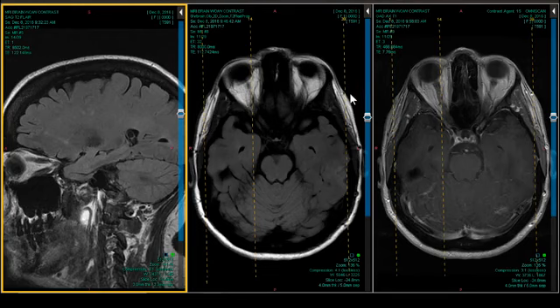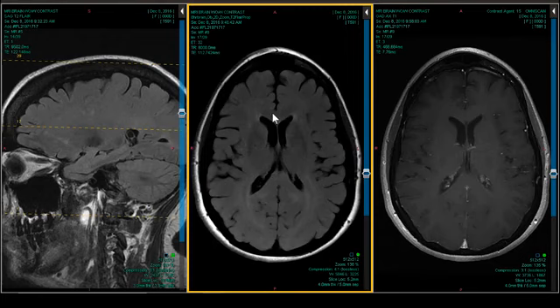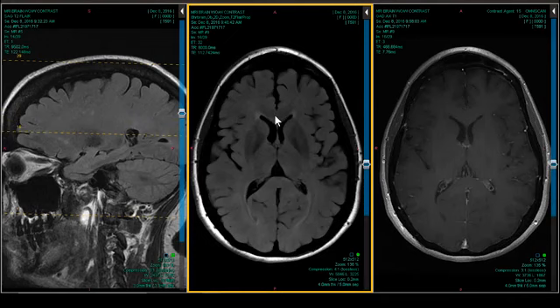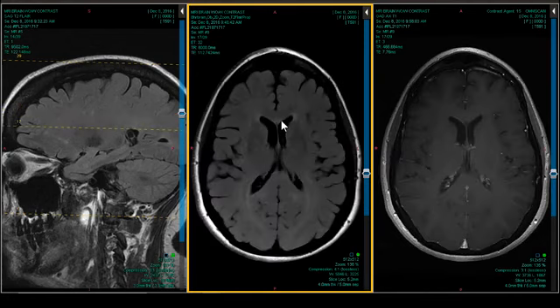So he had eye symptoms and any other symptoms? Hearing loss. So you do get hearing abnormalities in MS. Vertigo is more common. Vertigo about 6 to 8%, hearing about 1 to 3%. So it's a very atypical feature for MS. We've also got an atypical distribution pattern, really confined to the periventricular and callosal region. So you've got to start thinking about MS-looking diseases. And I've got about 3 or 4 in my quiver. How many do you have in your quiver? Let's talk about a few of them.